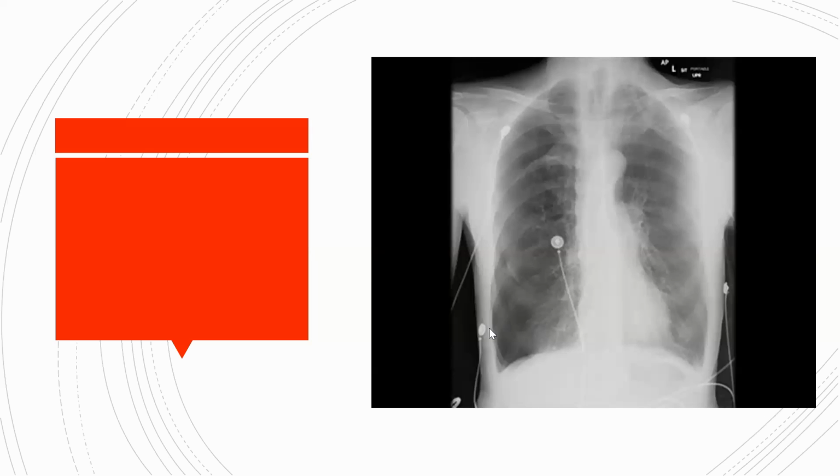Yeah, okay. COPD. Yeah, ECG leads, very good. Right, so a lot of you have gotten COPD. Why? Because the diaphragm is flattened. So if someone wants to say diaphragm flattening, loss of costophrenic angle, great job. I haven't seen that yet, but yeah, too many ribs. Right, there's something else that you guys haven't spotted. I knew I was going to trick you guys with this one. This one is quite hard. In comparison to the previous one, which was really obvious, this one is a bit hard.